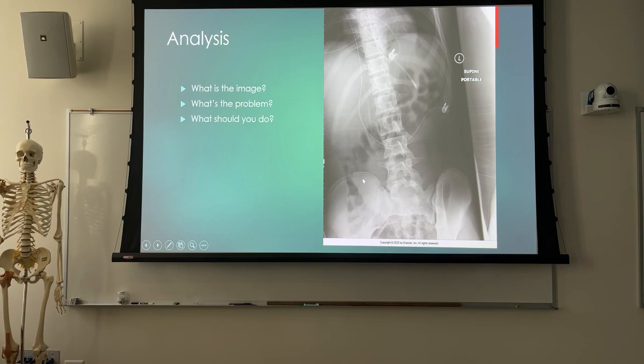In the duodenum. So your saving grace on this is they're going to advance that and call you again to shoot a second one to see if it's in the duodenum. Just stick around and shoot it again, right? Because they're going to want another one anyway, and that's the one you hand in. This is a burner in that case, right?